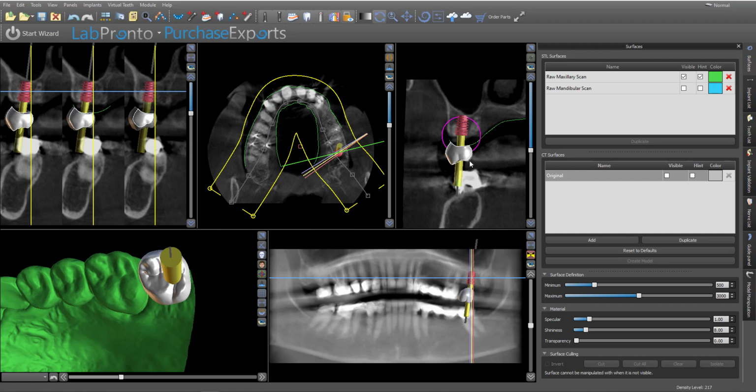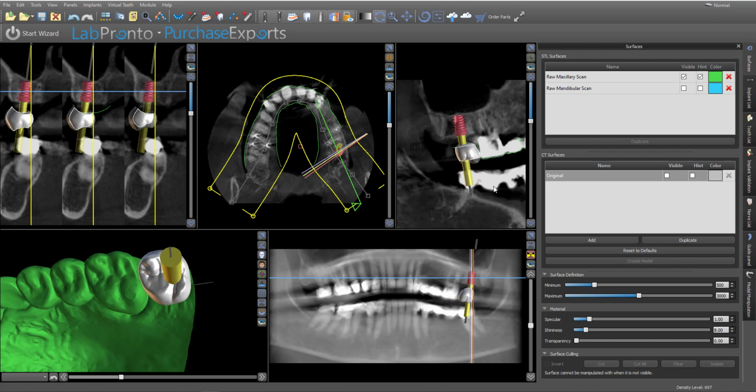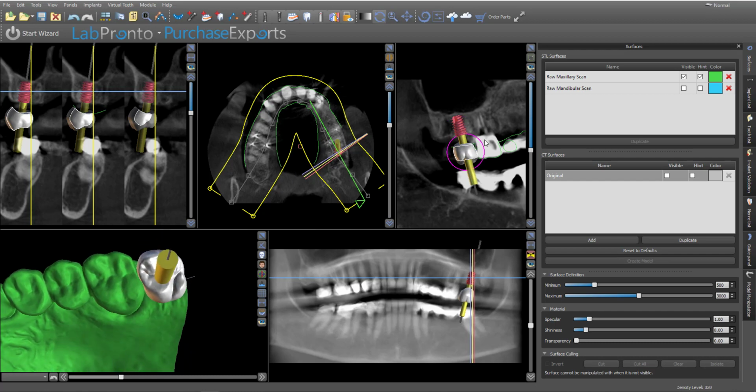So while this looks like it's good in the mesial to distal direction, if I look at it from a buccal or lingual, I need to get this implant straightened up and paralleling the adjacent teeth. And I'm probably going to bodily move it over just slightly. I always like to try and avoid putting a most distal tooth too far back. That's the tendency because you got all the room and you don't want to hit the adjacent root. But in my experience, the closer I'll place that to the adjacent tooth, the better I like the results.